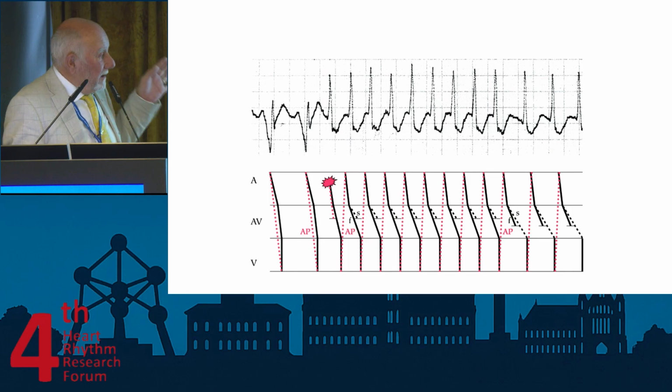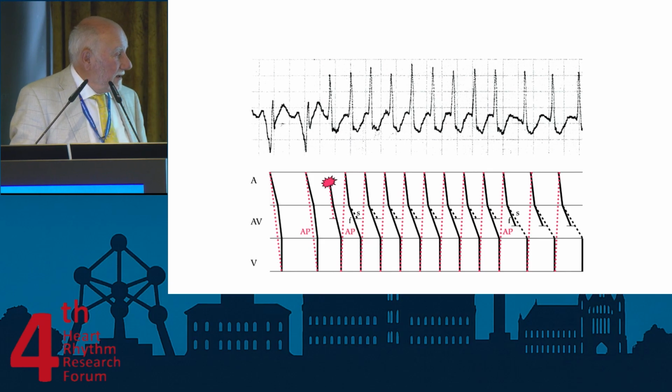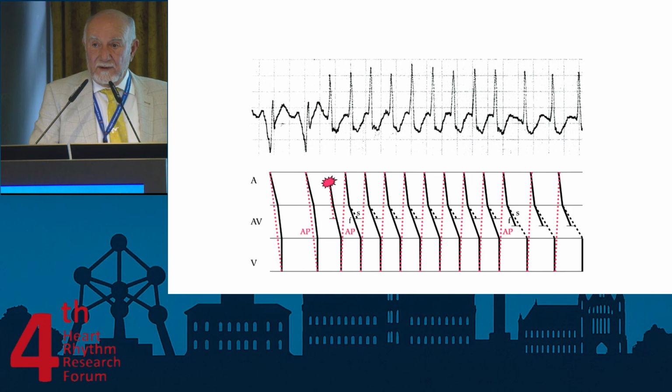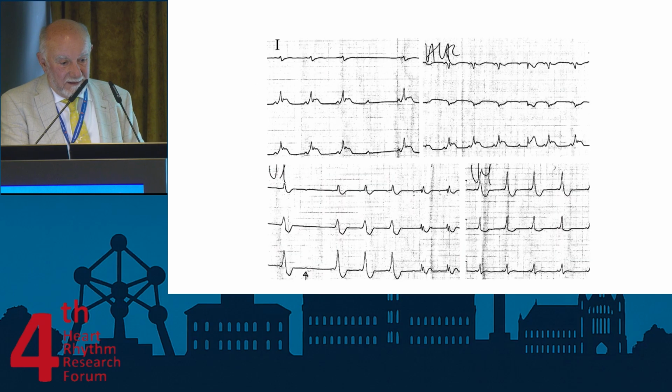And what we see, tachycardia starts, then it blocks on the fast pathway, jumps into the slow pathway, and of course the tachycardia becomes slower. Very good.